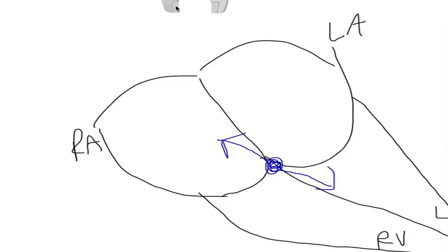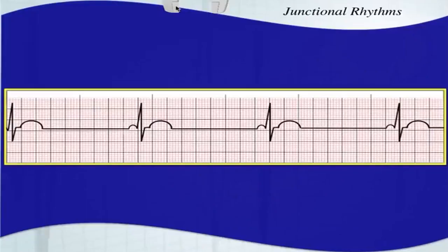And if you think about the way the leads look at the heart, this also explains, if this is lead 2 looking up this way from its positive electrode, why the P wave might be negative. The depolarization wave is heading away from the positive electrode in lead 2. I use lead 2 often because that is often the lead we monitor the heart's electrical activity from.